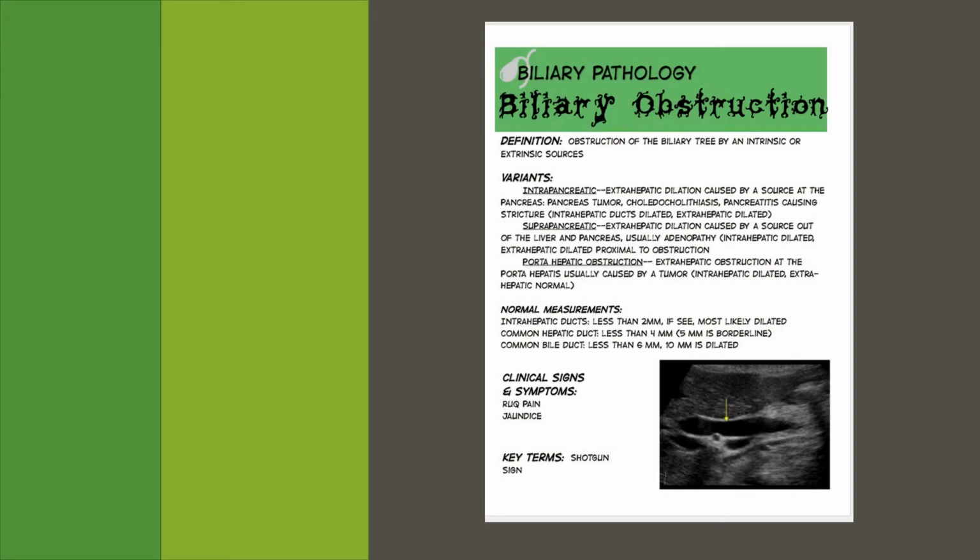Biliary obstruction really isn't a disease on its own, but it will present in the setting of multiple types of diseases. So it's important as a sonographer to recognize biliary obstruction, be able to figure out where that obstruction is happening, so then you can go and see if you can find the pathology that is causing the obstruction. So let's take a look at where common obstructions occur and some normal measurements.